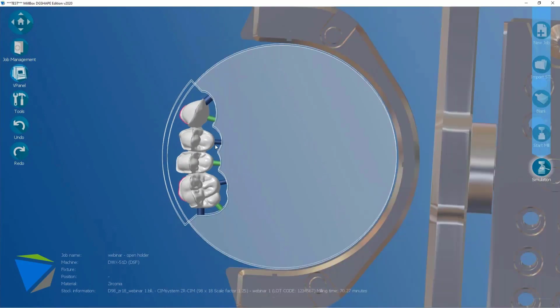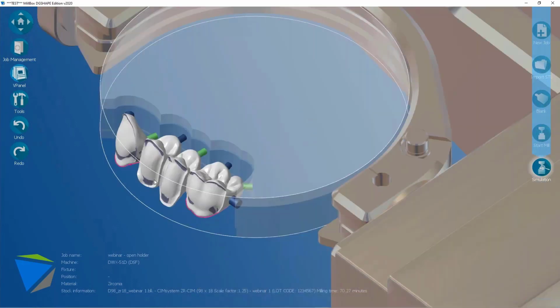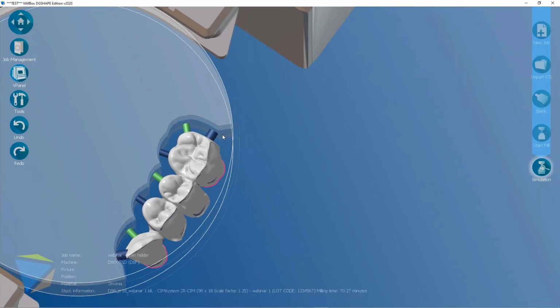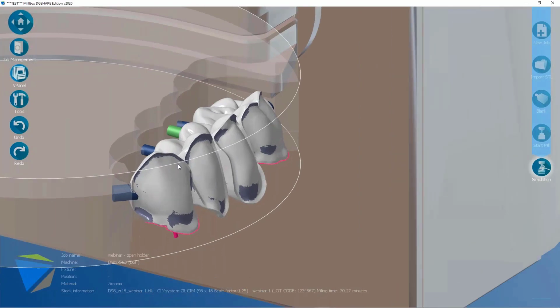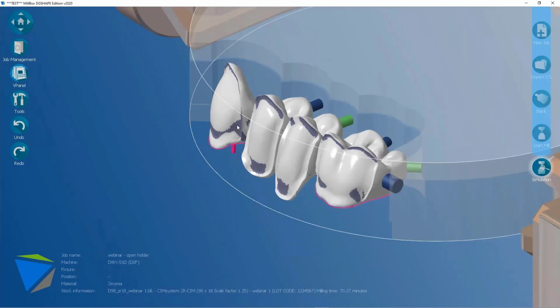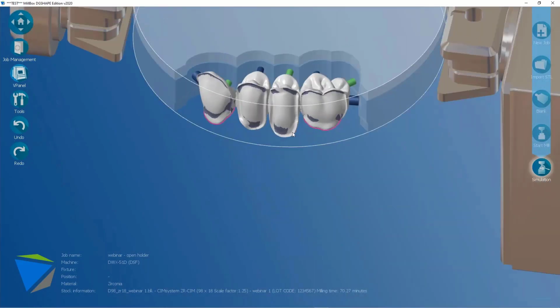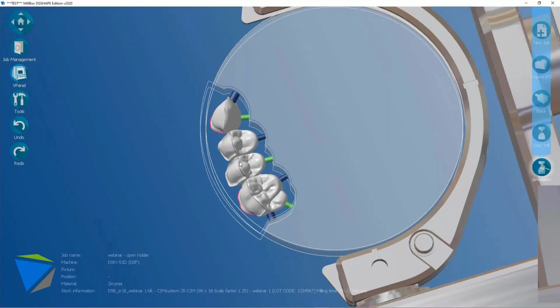How did I make it? For example, let me create another object. This is also why we may have the need to open here, milling this area, by breaking, for example, this area. Why? Because, for example, I want to be more precise on this kind of object. So the only way is to laterally hit the object. Otherwise, from this side, maybe from the other side, it could be not so easy. So by hitting the material, milling from this side vertically, you have more chance to be more precise, for example. It could be very comfortable to use.